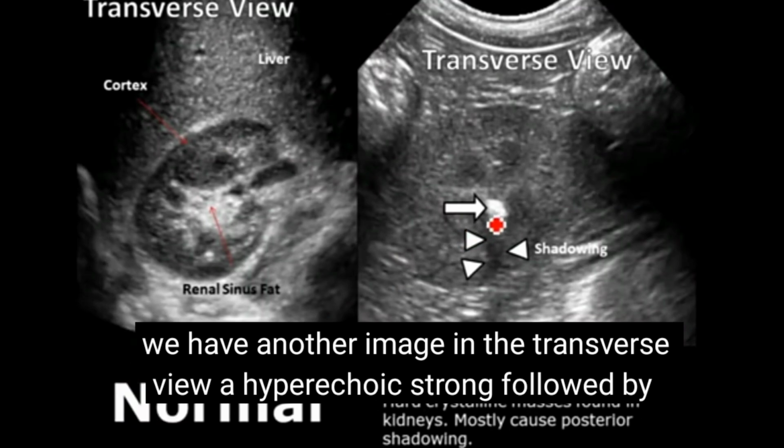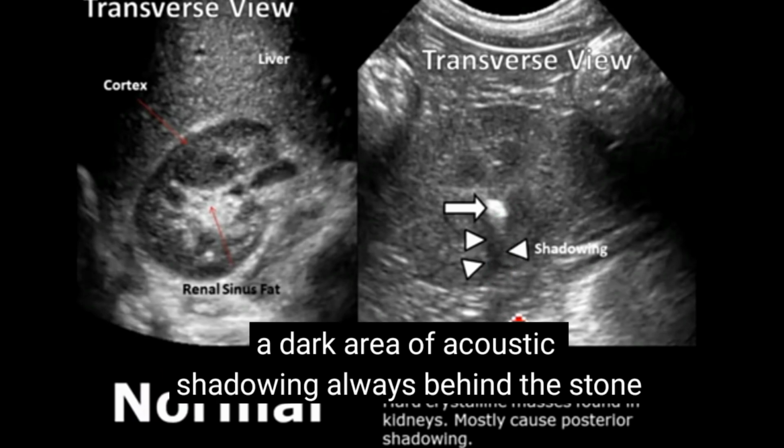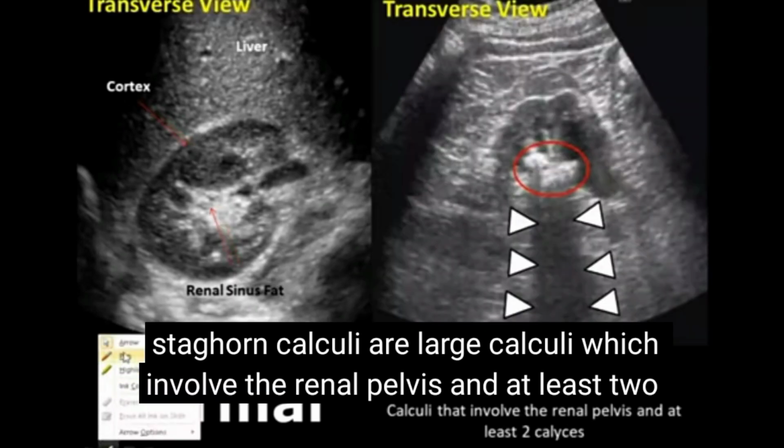We have another image in the transverse view, a hyperechoic stone followed by a dark area of acoustic shadowing, always behind the stone.